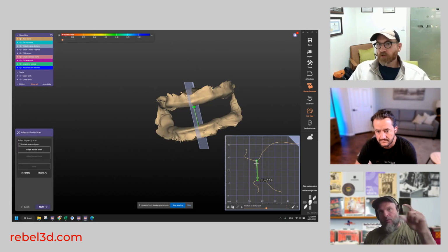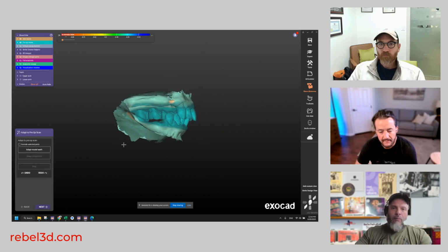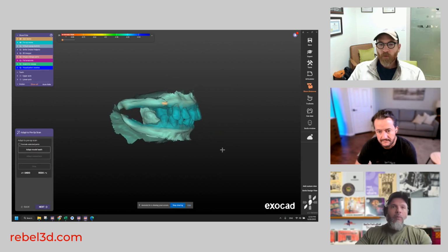That's very, very thin. So I'm either going to make the structure extremely thick buccolingually, which is going to impinge on the tongue space and all that, so this might be a problem. But let's put that aside for now. This is what I'm sent, and the doctor says, let's open the bite 3 millimeters or however much it is.